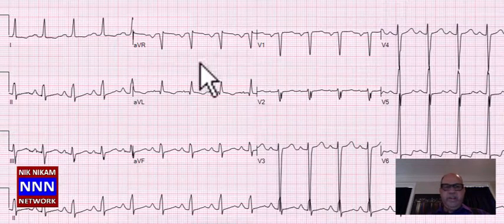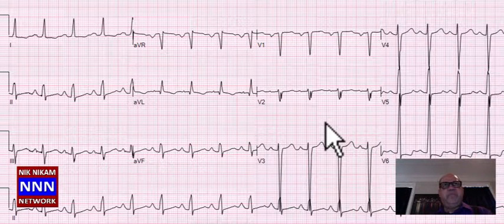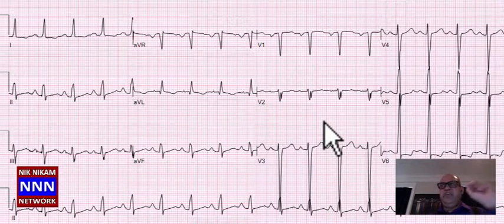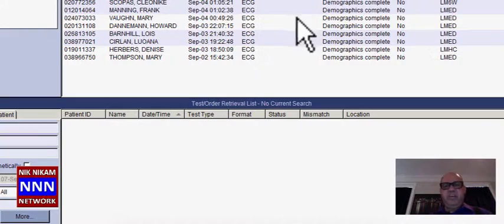And this is a 33-year-old patient. That means I begin to wonder, is this a renal patient with hypertension, left ventricular hypertrophy, left ventricular failure, left atrial enlargement? Maybe perhaps this patient is on dialysis. So these are all the things that should start rolling in your mind based on the age, the sex, and the condition, and where the patient is. If the patient is in the ICU, you wonder if they had cardiac surgery, if they had pericardial effusion, things like that.